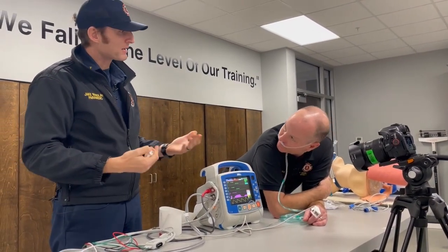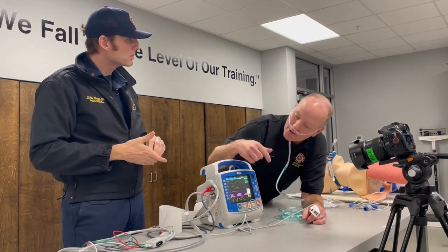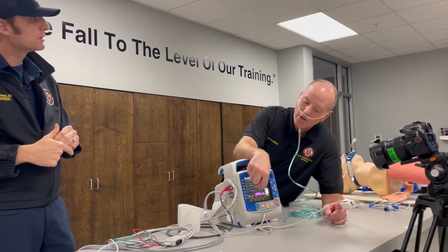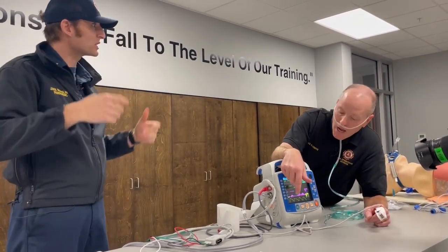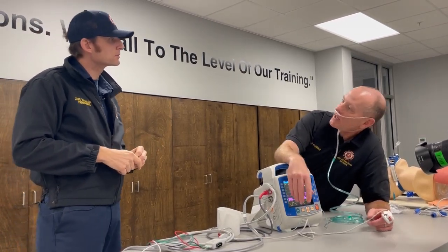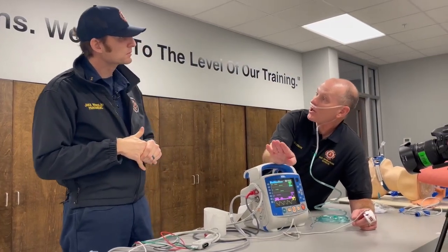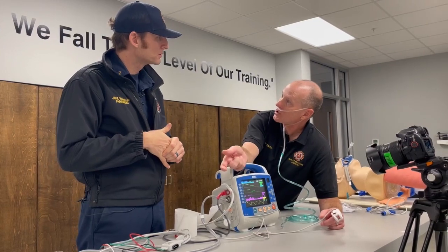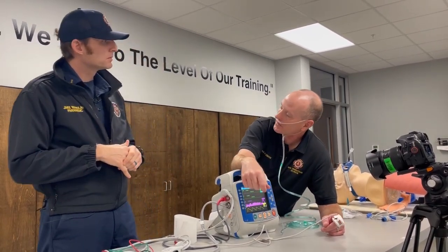What's another example, like capnography in itself, why we could utilize that? Cardiac arrest, is that important? It is. You actually will see on a cellular level, if they're using oxygen, particularly on the heart or the brain, you'll see your end tidal start to come up. So if we get a pulse back, you're going to see an increase. I'd expect my end tidal on a cardiac arrest with somebody not perfusing to be at least 10 to 15. And then all of a sudden it starts climbing. I know somewhere on a cellular level, we're utilizing oxygen and actually changing the CO2. So we're now looking at somebody coming back.